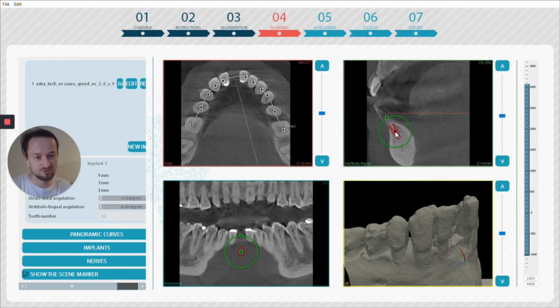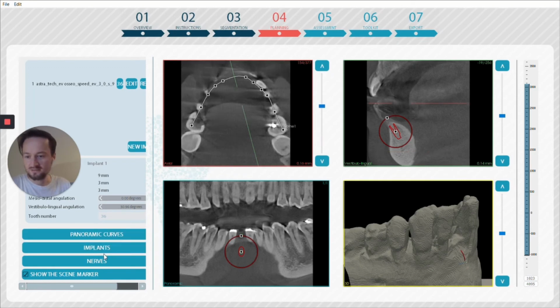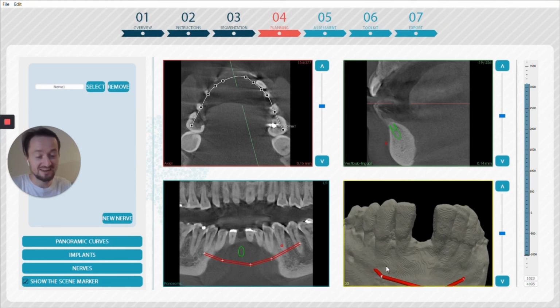A lot more criteria on implantology, so we can change the depth, for instance, and then the lingual, the distal, and everything else. So we're working with Nancy in France, the University of Lorraine, to be able to configure the evaluation exactly as we want it.